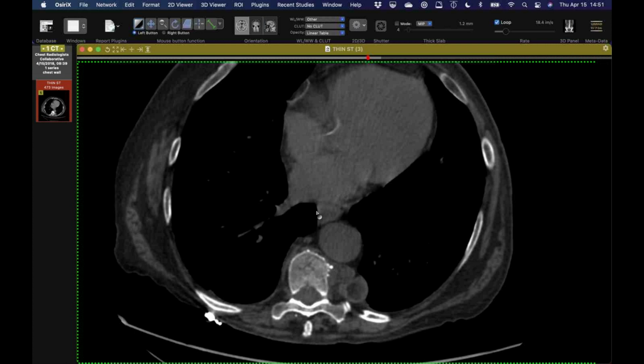Here we see it flip-flop, so it's probably actually true pockets of fat. It's very well circumscribed. It's separate from the neural foramen. It's sort of near a joint, but not really. There's no remodeling of the underlying bone, so there's no periostitis or pressure erosion. So whatever it is, it's non-aggressive. It hasn't grown.